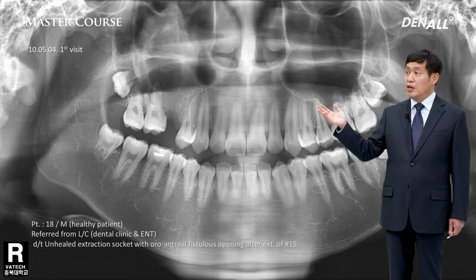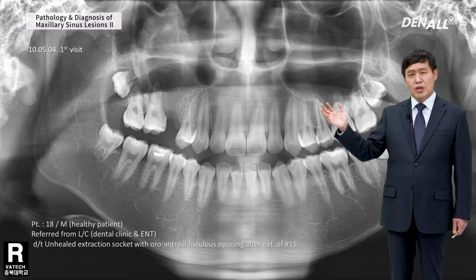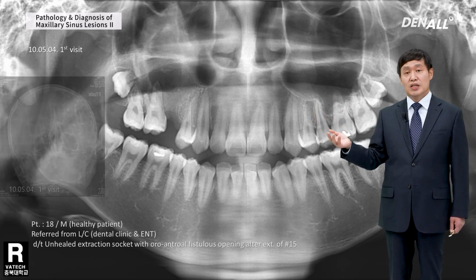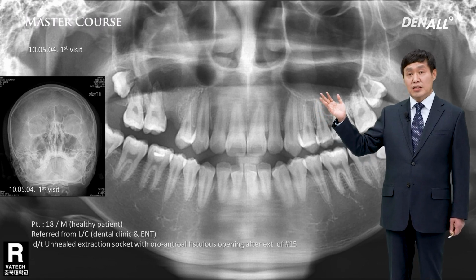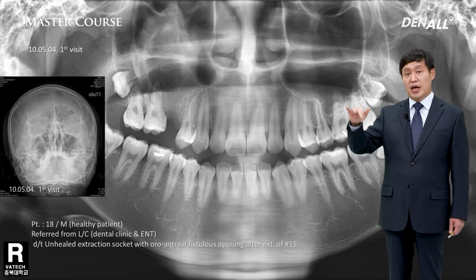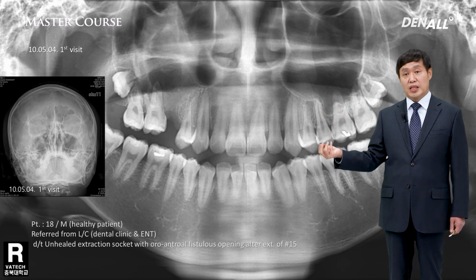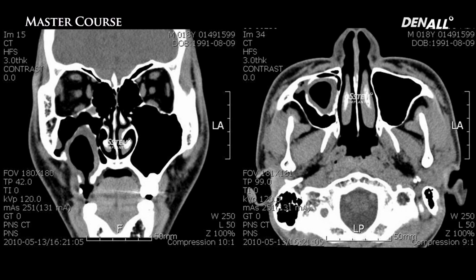In the panoramic image, on the right side of the sinus, there's a haziness, and overall, the condition of the sinus looks different, unlike sinusitis. I took a Waters view. On the right side of the sinus, there's a round bone-like mass. There's radiopacity. There's patency with the oral cavity, so there's air observed in the plain film. I took a CT.